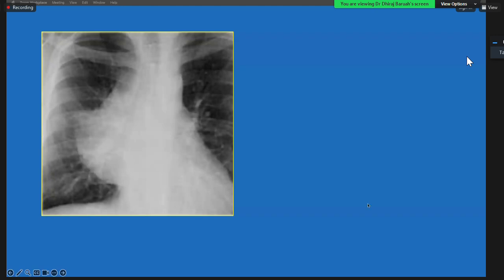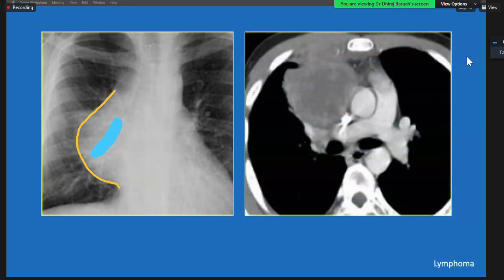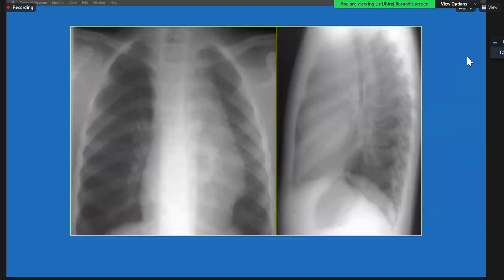So as I said before, you see the margin of the cardiac structures only when there is a lung interface. So when you have an abnormality which is displacing the lung interface, you will not see that margin. So in this case, you see the abnormality and you see the pulmonary artery. So this is not in the middle mediastinum, and you do not see the right heart border. So it will have to be in the anterior mediastinum. So this is a lesion in the anterior mediastinum.